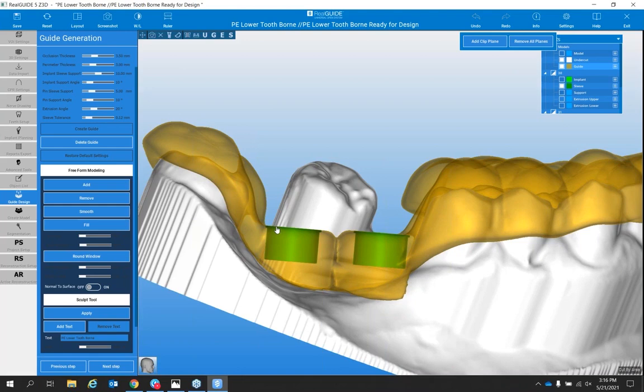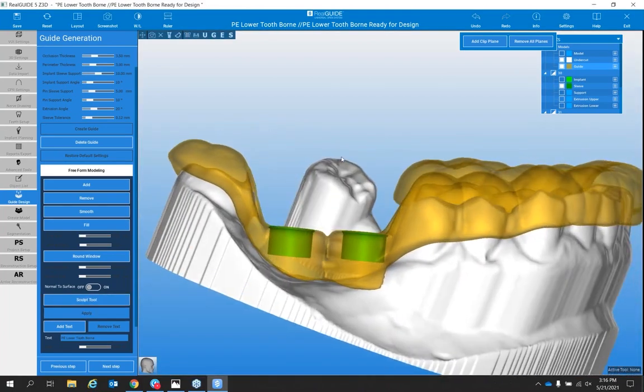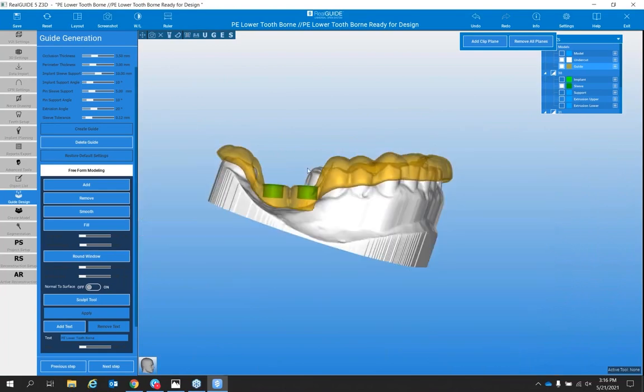I'm going to start just above our sleeve, hit the left click to add our orb, and I'm just left clicking, adding each individual orb how far I want to go. All of this excess highlighted in our purple cut tool, I'm going to go ahead and sculpt that out. So I'm going to hit apply, and that's going to make some clearance for us on the distal side.